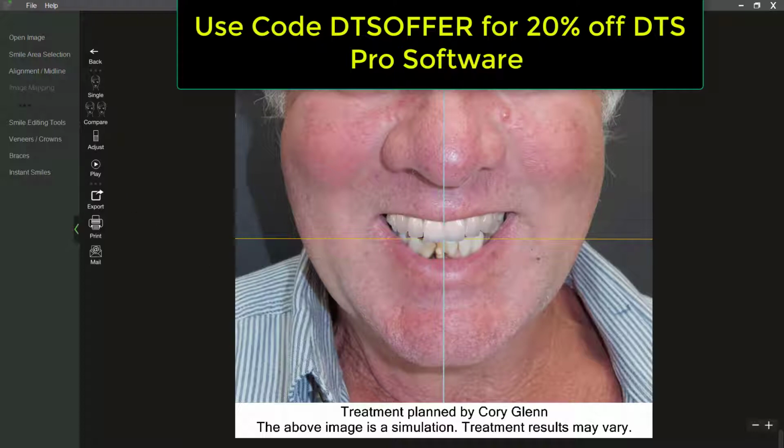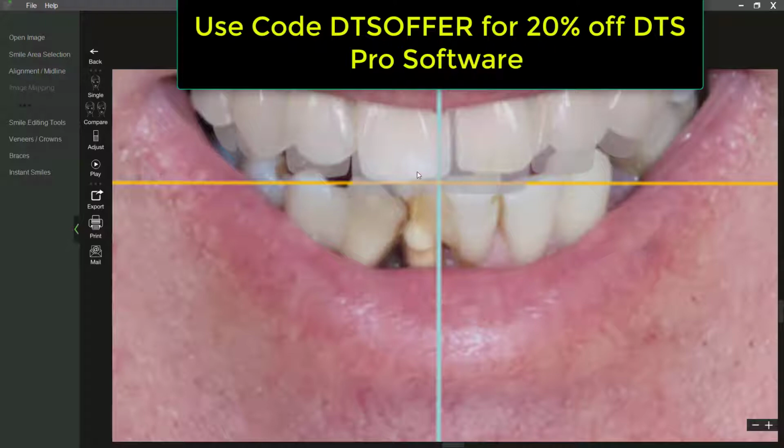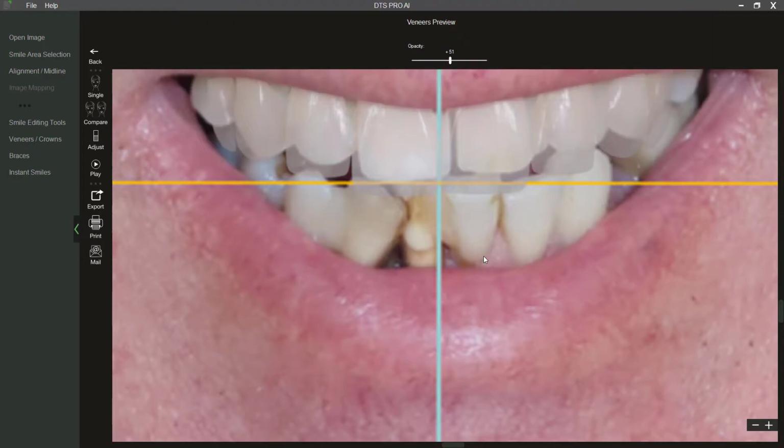I can look at this and say, okay, there's the ideal teeth, but as I'm trying to do my 3D wax up, I can zoom in here and see, okay, his existing tooth is right there, but based on what we've decided is ideal, I can see I need to add 1.5 millimeters of length here, 2 millimeters on that one, about 3 millimeters on this one, and so forth. And it just makes it so easy to go back and forth and generate your ideal 3D wax up without guesswork. It's just very precise. So I hope you found that helpful.